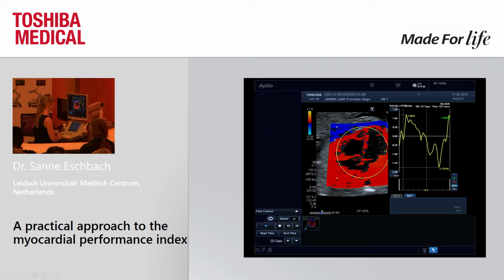Clearly we can see the change of motion in the cardiac wall. Here it's the beginning of the contraction time, and there it's the end of the contraction time. And here is the beginning of the relaxation time, and here's the end of the relaxation time. And we can measure the percentage by checking the whole cardiac cycle.